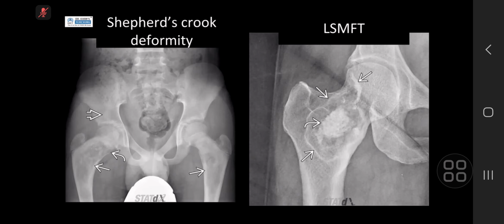So the lesion on the right used to be called a liposclerosing myxofibrous tumor. It's now thought to be on the spectrum of fibrous dysplasia. So just be aware that those lesions tend to occur in the intertrochanteric region or femoral neck, and you can see that densely sclerotic focus centrally, and they tend to be a little bit more well-defined with a sclerotic margin. You can see the differences with the two images side by side there.